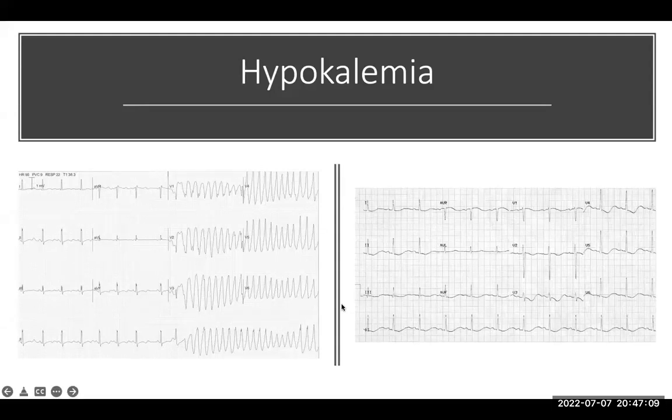And usually hypokalemia is a very good ground for bringing ventricular tachycardias and so on. That's why in the ACLS protocol, I'm sure you have gone through the training, you always talk of the hypos, and one of them is hypo or hyperkalemia because it can degenerate into malignant arrhythmias. As you can see, this patient was in normal sinus rhythm. All of a sudden, something happened. This is what we call the R on T phenomenon, because potassium changes the membrane potential of the cardiomyocyte, thus making it a very fertile ground for degeneration into a chaotic arrhythmia like ventricular tachycardia.